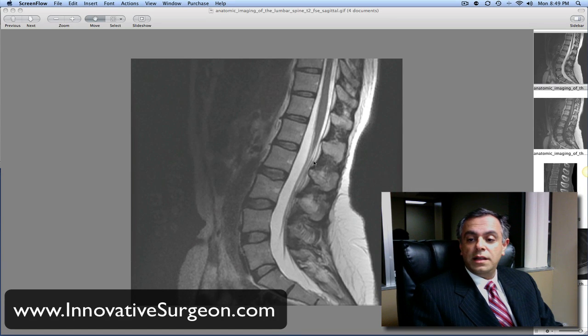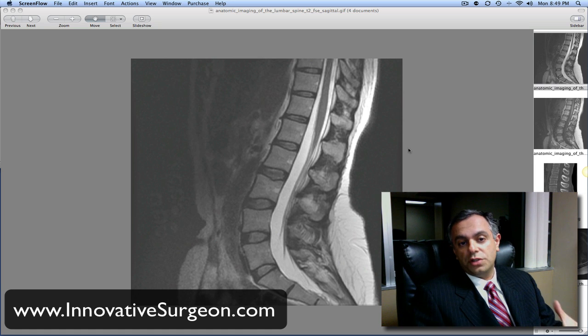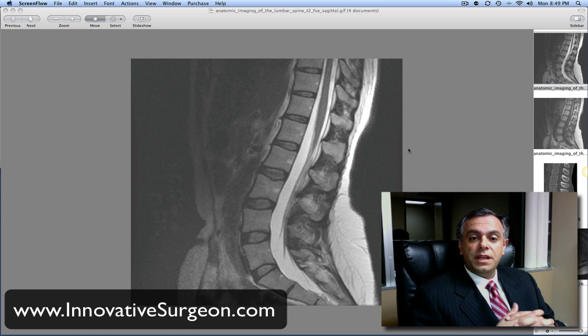Hello everyone. In this video we're going to discuss the normal anatomy, what you should be looking at in a normal MRI of the lumbar spine, the lower back. Again, some of you might have some back pain, some leg pain and got an MRI or some CT scan of your lower back, and then you don't know what it looks like. What is normal? What is abnormal? What should you be looking for?